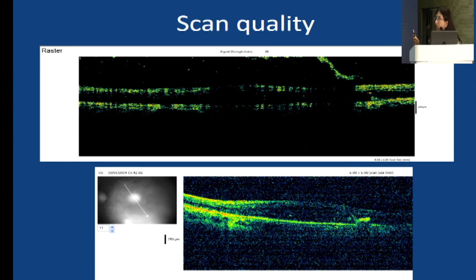this pointer is not working well actually. It's very weak. Anyway, so second picture, you will see overall there's a more noise ratio.